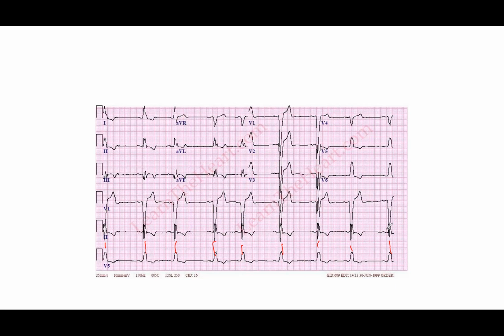So it could be like an atrial fibrillation or a wandering atrial pacemaker, right? Different kinds of causes of that. But we don't have any fibrillations or atrial fibrillations going on here, so I don't think it's that. And we have pretty much the same morphology on our P waves, so it's not a wandering atrial pacemaker, right?